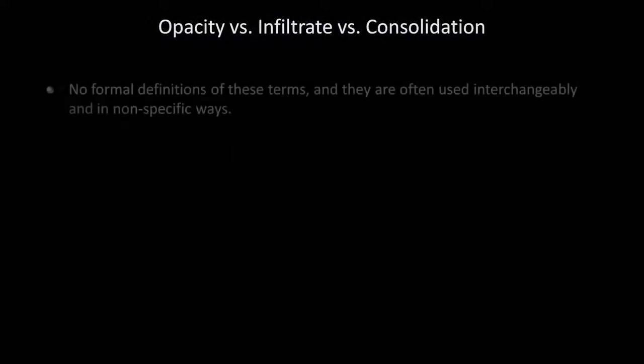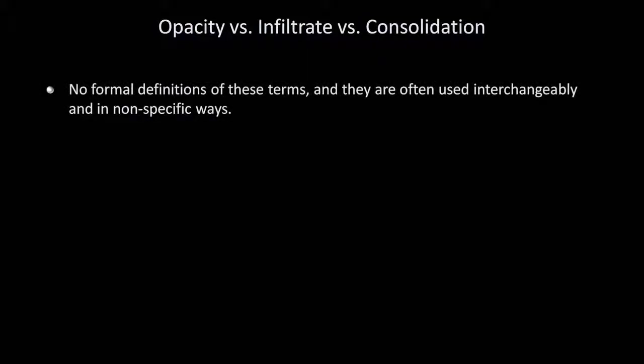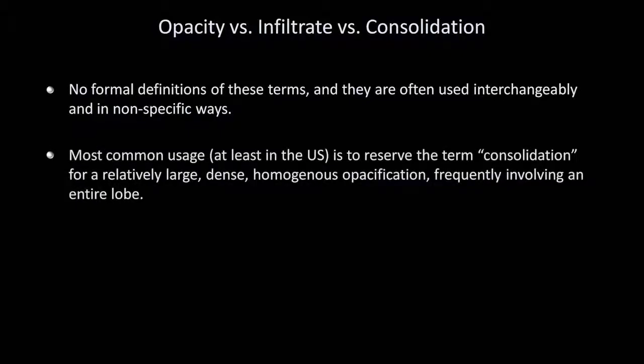So let me now talk about some focal opacities. The first thing to discuss is the distinction between the confusing terms opacity, infiltrate, and consolidation. There are no formal definitions for these terms, and they are often used interchangeably and in nonspecific ways. In the most common usage, at least in the US, the term consolidation is reserved for a relatively large, dense, homogeneous opacification, frequently involving an entire lobe.